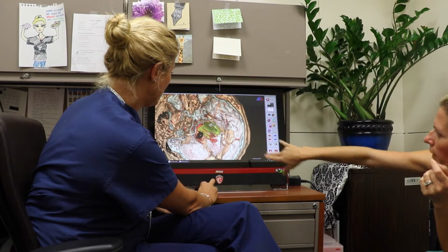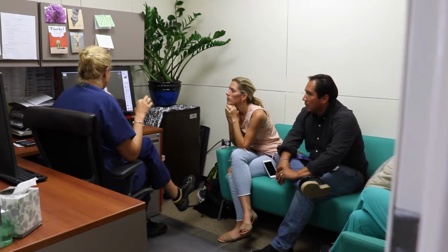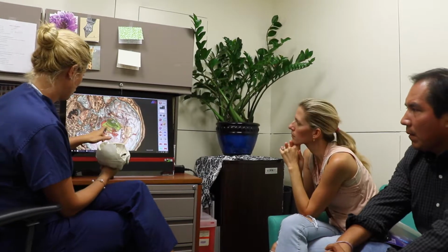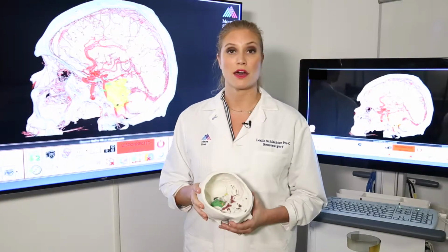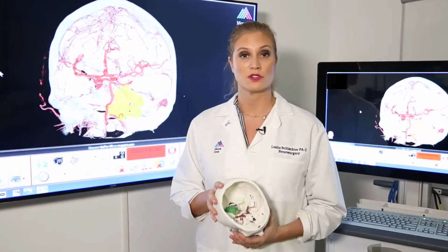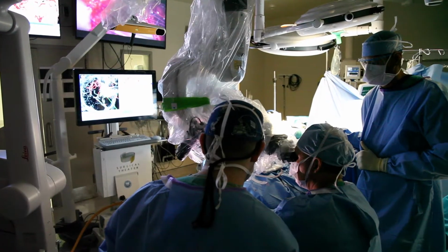We do, for all patients, prepare a 3D simulation for them to allow them to see before surgery to have a better understanding of their condition and pathology, and we use that for preoperative planning and intraoperative navigation. What I have here is a 3D model. We don't do this for all of our cases, however, some specific tumors do call for a better understanding of their pathology prior to surgery.